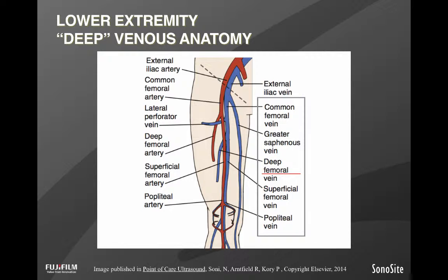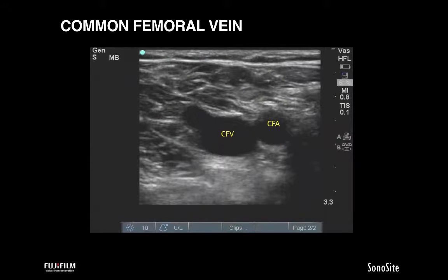As we go on today, I want to make sure that what you take away is a really good knowledge of the anatomy of the lower extremity. That's largely what we're going to focus on, and I think it's very important to know exactly where the veins are coming in, knowing that thrombi most commonly occur at branch points. So knowledge of the anatomy, especially on ultrasound, is very important in order to gain competence and expertise.